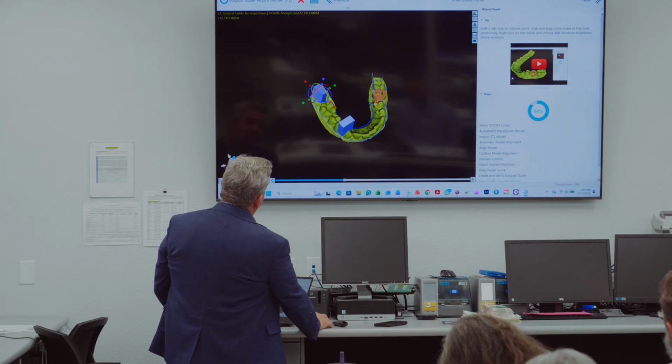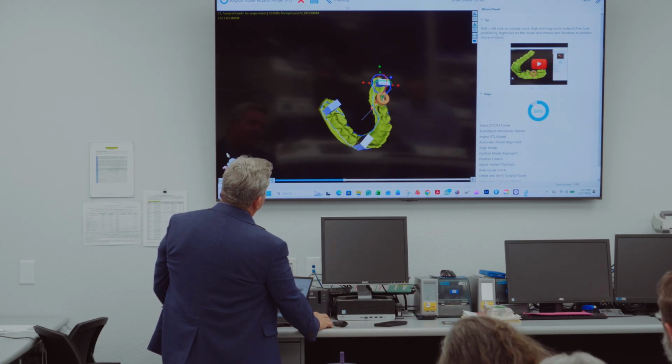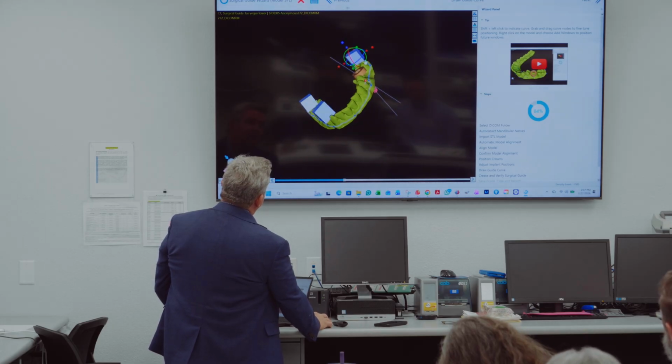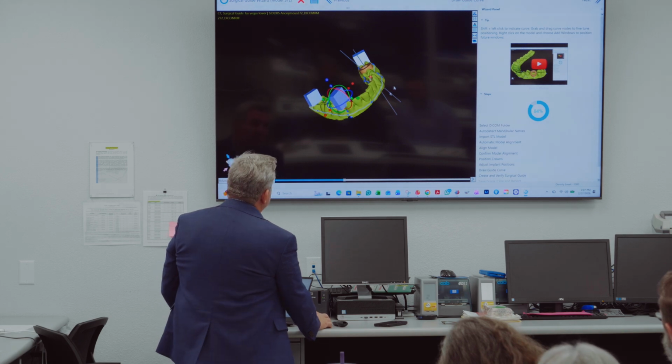Whoops. Wrong loop. There we go, like that. Okay. And you probably want one over here too. Rotate it around. Bring it up a little bit. Then we can see the occlusion. It's like that, okay? You can even move this one a little bit. That's okay, because we know it's going to be seated there.